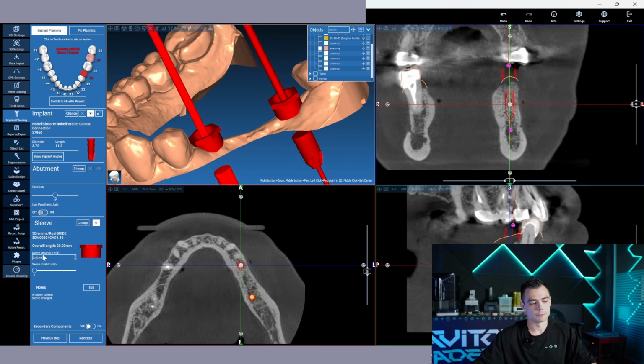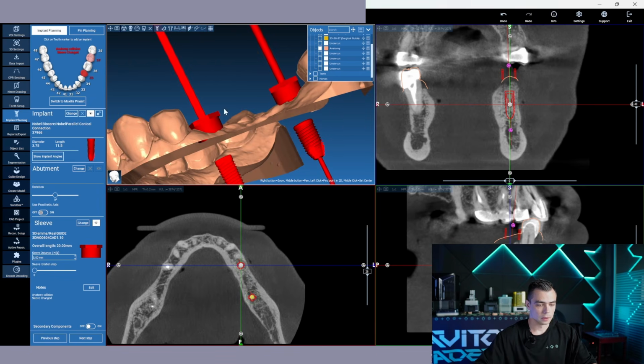Once again, offset, in terms of making surgical guides, is the distance between the lower edge of the sleeve and the upper edge of the implant. In RealGUIDE and other software dedicated to surgical guide creation, you can adjust this number like 8, 7, 6 and so on.